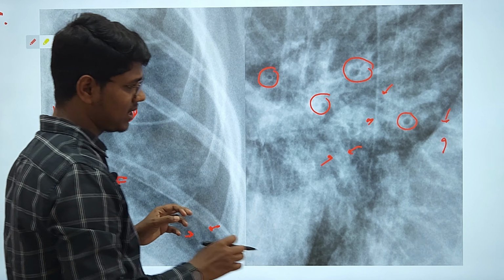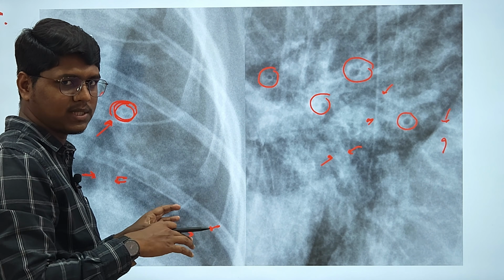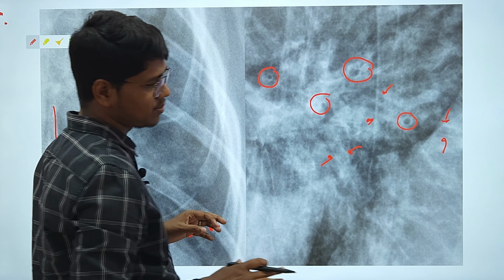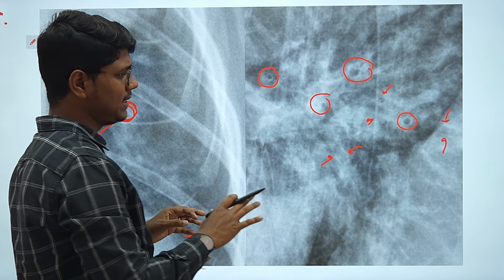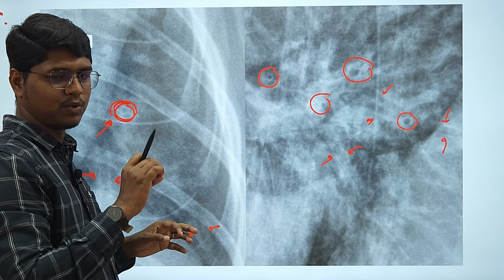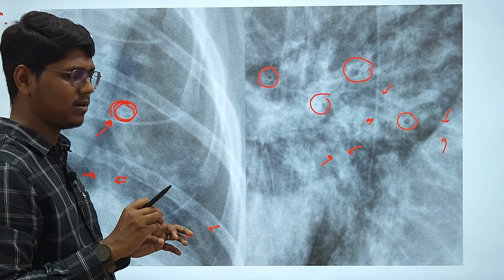This particular dog has been diagnosed with cardiomyopathy, and then the radiograph was taken. So it was found that in this particular case you may find the bronchial pattern, instead of the most common notion, that is the alveolar pattern.